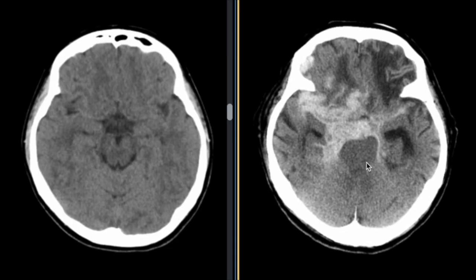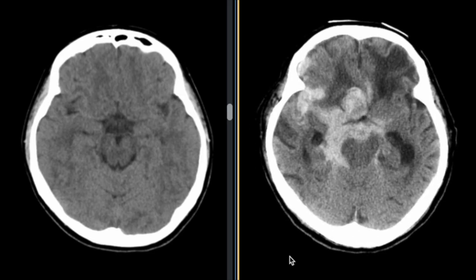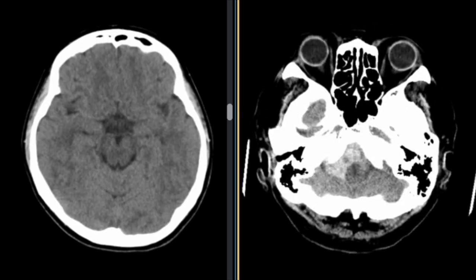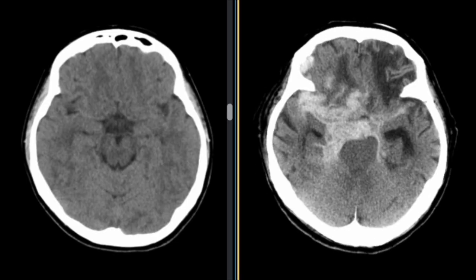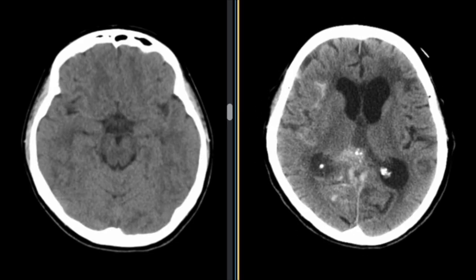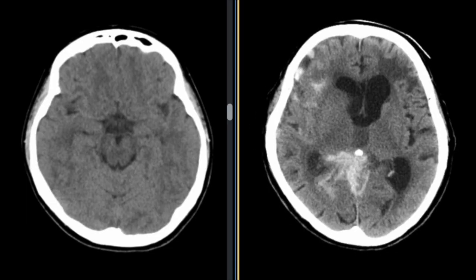On CT, blood appears white. As the term suggests, subarachnoid hemorrhage refers to bleeding just beneath the arachnoid membrane that envelops the brain. Large intracranial arteries travel through this space, so when an aneurysm ruptures, blood accumulates along that pathway. There may not be an obvious mass effect from the blood on the brain parenchyma, but in reality, the intracranial pressure skyrockets due to the massive hemorrhage. The brain parenchyma, trapped inside the skull with no room to expand, is constantly squeezed and suffers ongoing damage.